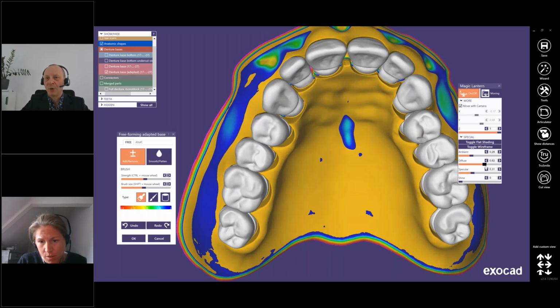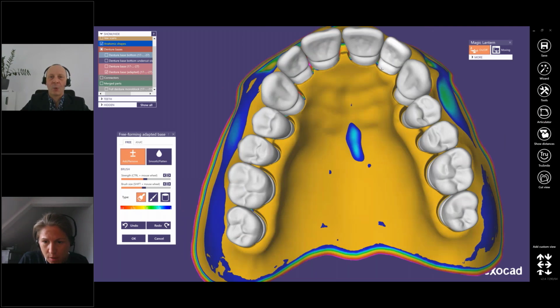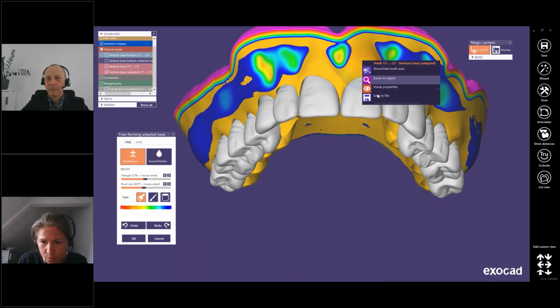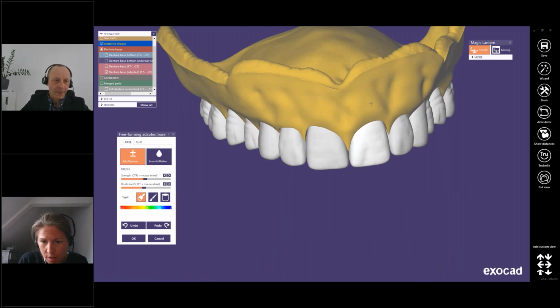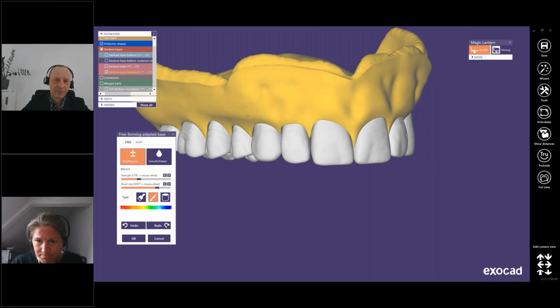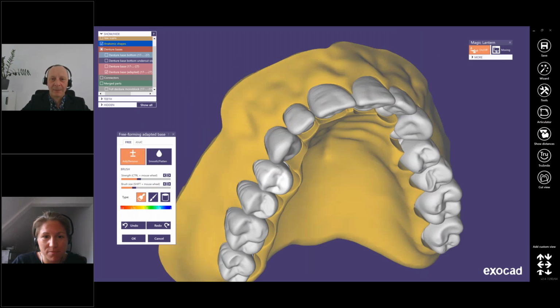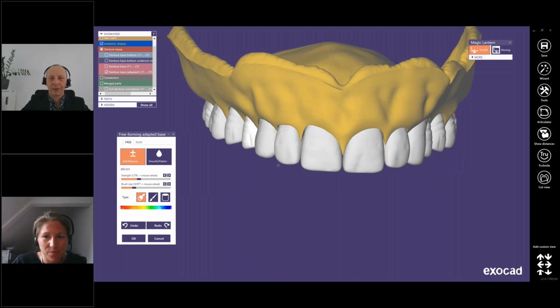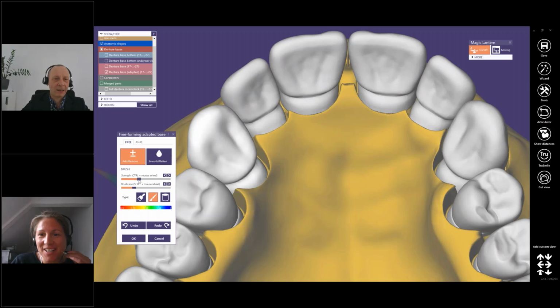Feel free to use Magic Lantern; the shortcut is Ctrl and B. So a lot of tools, like this point knife tool, for example, to make roots. You can smooth anything, and you can add some structures here and so on. What is the question exactly?